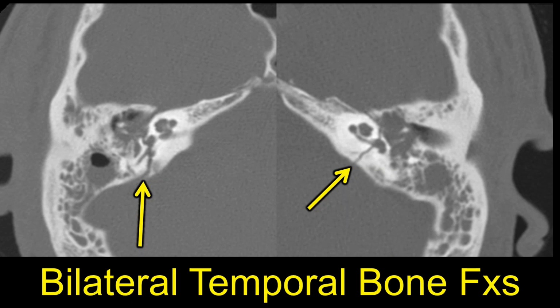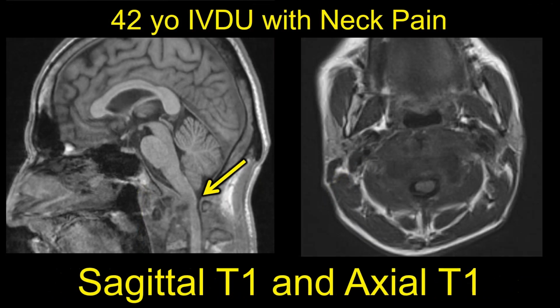Now, when we're looking at bones, like the skull base, and I use it for all the vertebral bodies, we want a much wider window than what we were talking about before. We want something like 4,400 so that we can see these subtle osseous changes that we might differentiate on temporal bone CT studies. So these are on both sides fractures that go through the basal turn of the cochlea. So these are otic capsule involving fractures. So in terms of the patient's future morbidity and how well they're going to recover, whether it involves the otic capsule or spares it is important.